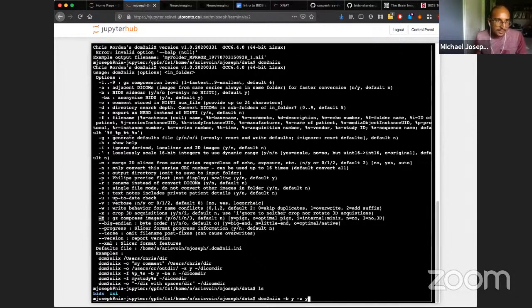And then sometimes, if you really want to make converting the dataset a lot easier, you can output the file with a specific kind of format. I think by default it outputs in a specific way, but if you wanted to include the series description, the echo number, any kind of scan parameters like the manufacturer, the name of the participant, you can control all that with this -f flag.